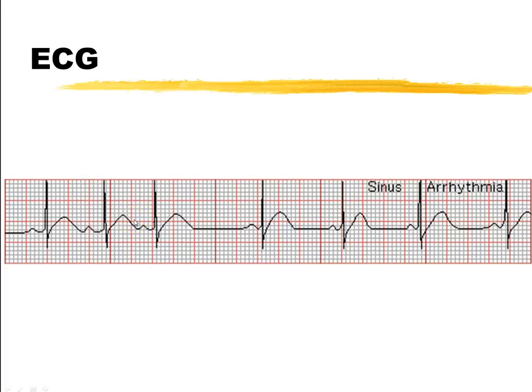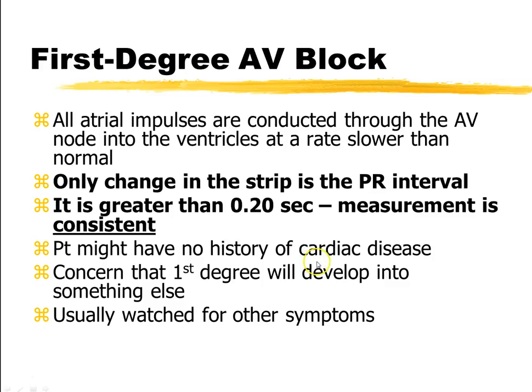Grab a piece and hook it up to your screen right now and just mark the edge of the paper where each of these are, and then you can slide your paper over. That's kind of what I call a poor man's caliper, and it will work every time because you have those little hash marks on the edge of your paper and you can slide it over. So if you're at work, you can just grab a scratch piece of paper, make a hash mark on each of those lines, slide it over, and you can tell really easily if it's regular or not.